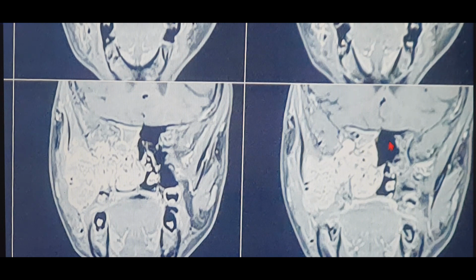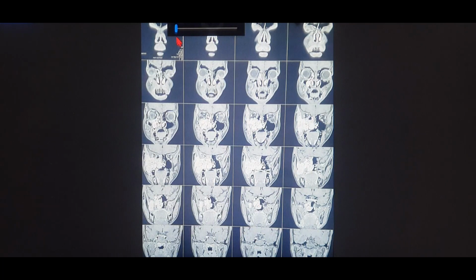This is basically towards the area of the sphenoid, and that's the area of the orbital apex, and that's the temporal lobe. You can see the sphenoid sinus full of collection because of secondary sinus obstruction. So this is how you should be fluent in identifying MRI scans. This is the tumor, and you can see the tumor entering through the inferior orbital fissure. This area is the pterygopalatine fossa, the sphenopalatine foramen, and above we have the inferior orbital fissure. So this is how you should be able to read a scan.